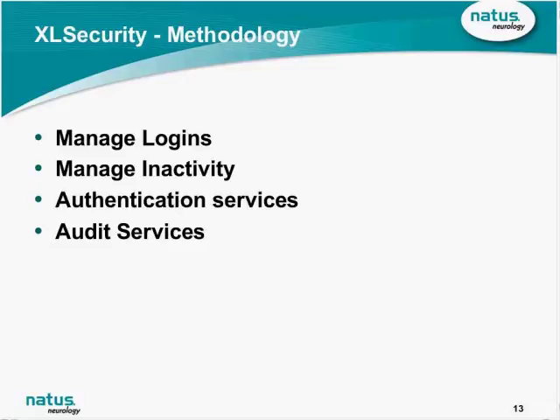However, we don't want them to have the ability to purge or archive a study. We'd like to maintain that function for a different person on our staff. So with authentication services, what I mean is allowing or denying users access to parts of the system's functionality based on the permissions that you create.